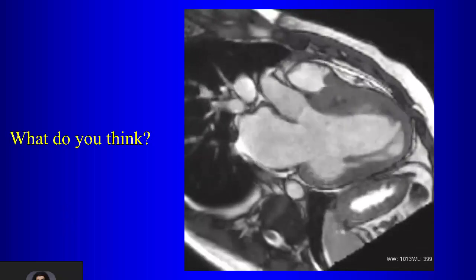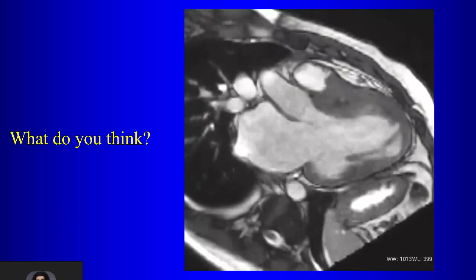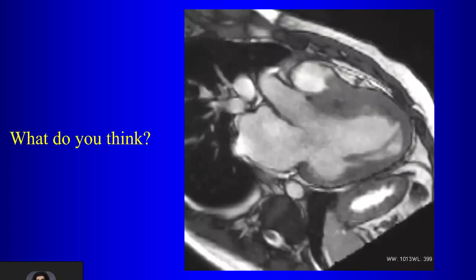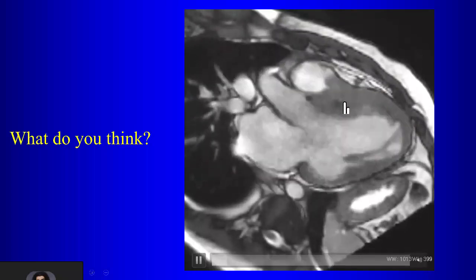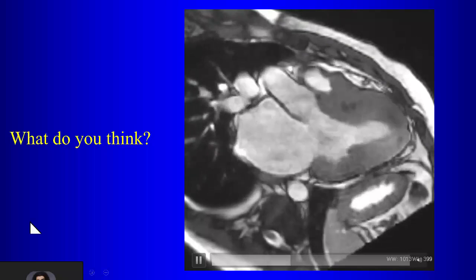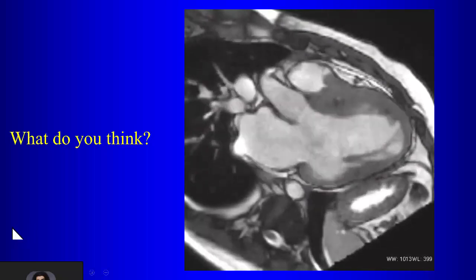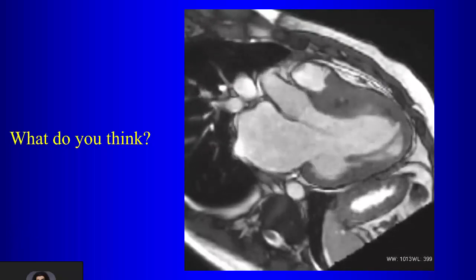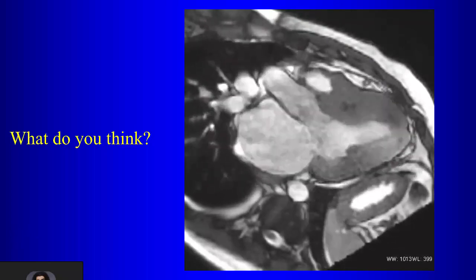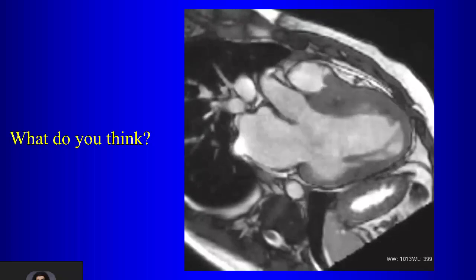So this is hypertrophic obstructive cardiomyopathy. How do you know? Now the septum is hypertrophic, right? So you can see all this hypertrophy in the septum extending to the outflow. There's also a bonus finding here. What's the bonus finding? Systolic anterior motion. So how is that manifested?